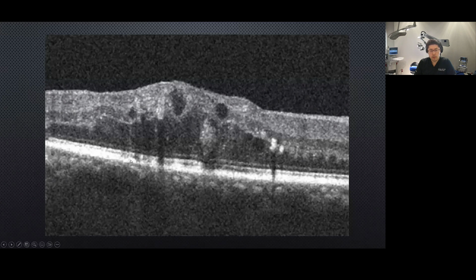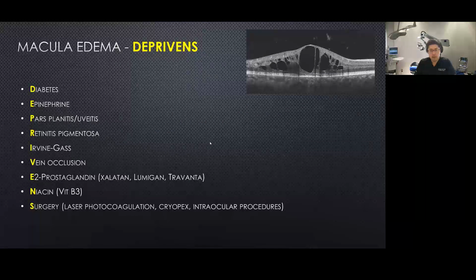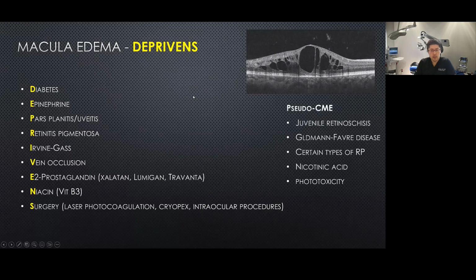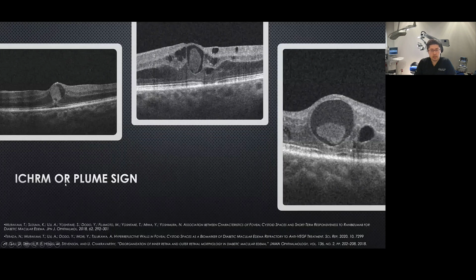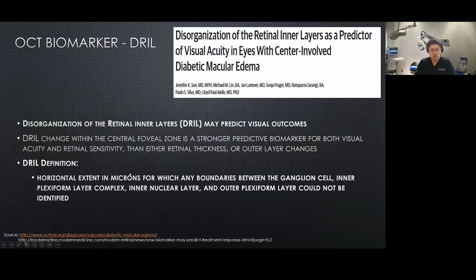Whereas I'll go back to a picture of macular edema secondary to retinal vein occlusion, as we see in this top right hand corner. You see the picture is very clean with clean hollow cysts. And these are usually macular edema secondary to retinal vein occlusion and inflammatory process. Whereas when you look at the pictures of macular edema from diabetes, there's always something in there and the fluid is not as clean. So that's just a simple way of looking at it, for myself at least.